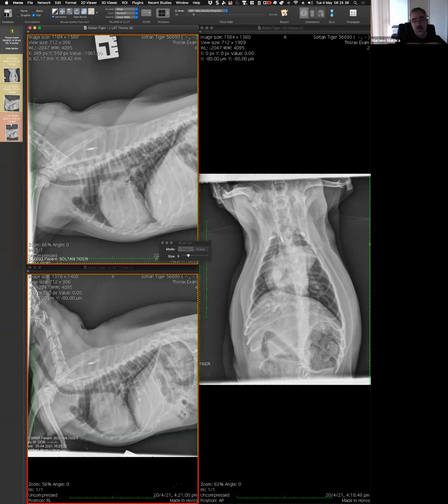So that's one option. Another option is that we don't go anywhere, and then I guide you more. But I would prefer you putting forward hypotheses. Like there were two or three already there. One was the pulmonary outflow tract. If we're going to pull from that idea, then we need to explain the rest of the findings based on that idea. The other one that was put forward was, are those lymph nodes? And if that is the case, then can we pull from that idea and see if that fits or it doesn't fit, or if we can put all of the findings under that disease process.